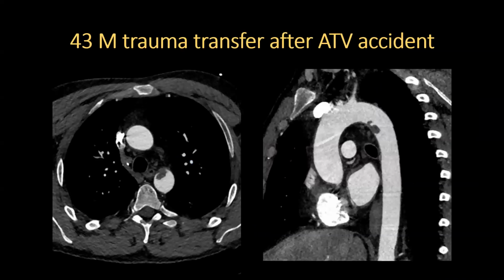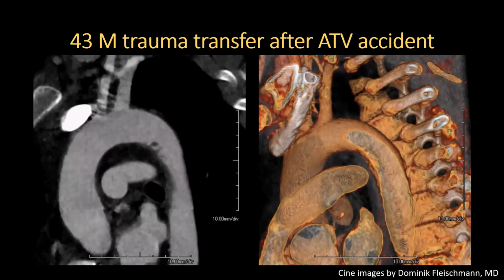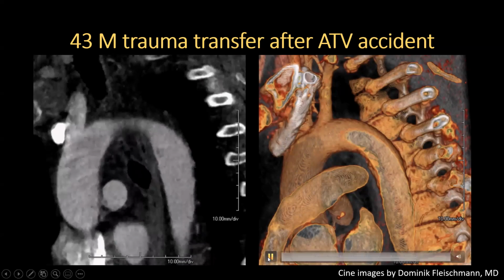Now that we've discussed the classification of traumatic aortic injury, let's look at more case examples. I've collected some straightforward and some nuanced cases to illustrate the strengths and ambiguities of the classification systems. This was a 43-year-old man in an ATV accident. We see this large filling defect adherent to the aortic wall at the level of the isthmus. On cine images, the thrombus is quite mobile. While we don't directly see the intimal injury, we see the associated thrombus.